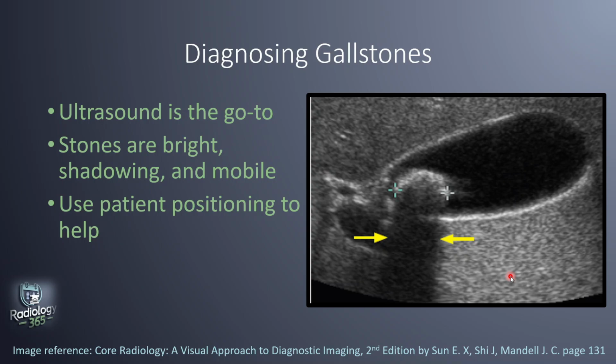like a polyp. So this image is an image of a single gallstone. It's a sagittal ultrasound of the gallbladder, and it shows an echogenic gallstone that's marked by these calipers in the gallbladder neck, with posterior acoustic shadowing here, shown by these yellow arrows.